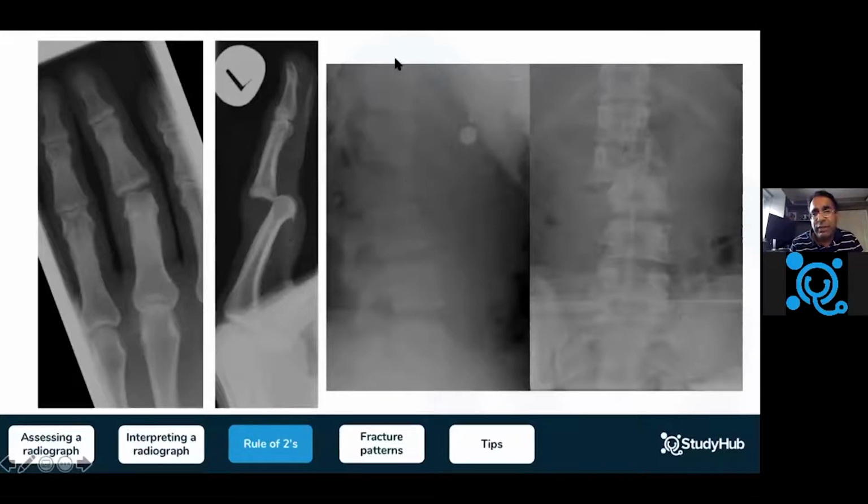Now, take this one here, for example. This is a spinal radiograph. Yes, the fairly obvious abnormality here is a fracture involving the L2 lumbar vertebral body. Yes, there is some posterior movement, which could imply that the spinal cord is probably compromised. But when you get an AP view for the same person, you actually see the degree of seriousness of the injury, which has moved things apart. This would require a spinal surgeon to attend immediately to prevent any further damage to the spinal cord or the nerves coming off the spinal cord in this case.